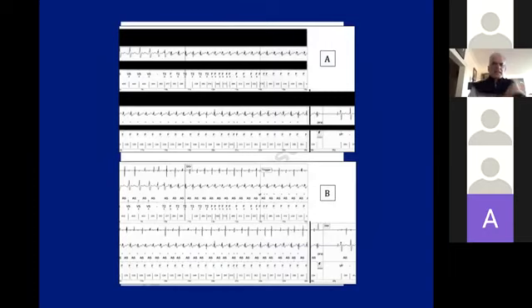Here's another example. This is more complex. Again, the atrial channel is covered on top, and at the bottom, I already uncovered that. You see that morphology changes, but despite the fact that the morphology changes and the device thinks that this is VF, see this VF? I'll enlarge it a little bit and we'll go over why the device thinks this is VF. When you look at the atrial channel, there is one-to-one AV association. So this was actually SVT, and it starts with a PAC, not with a PVC.